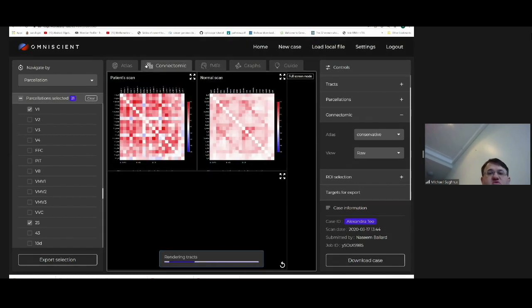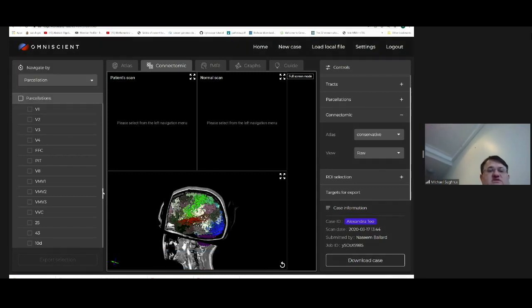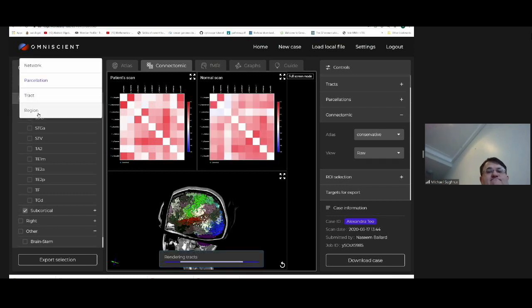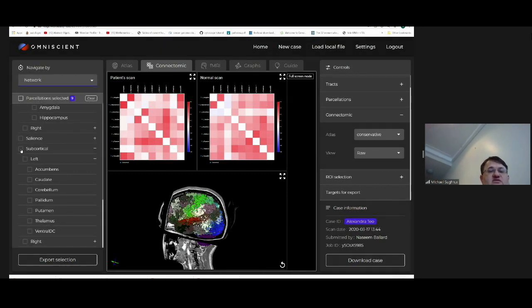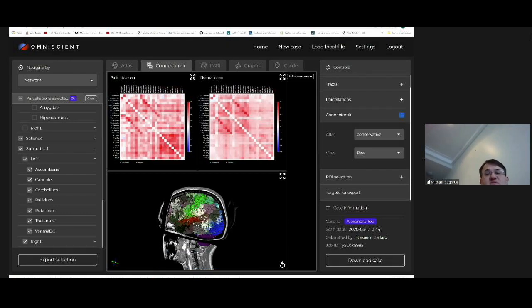Looking at one more thing before we move on, it's possible to look at how subcortical areas talk to or correlate with cortical areas. So notice that we've mapped subcortical areas into the scheme. So it's possible to look at, for example, basal ganglia structures, the diencephalon, etc., and look at how it's, for example, talking to the salience network. So again, it really is simplified working with data.